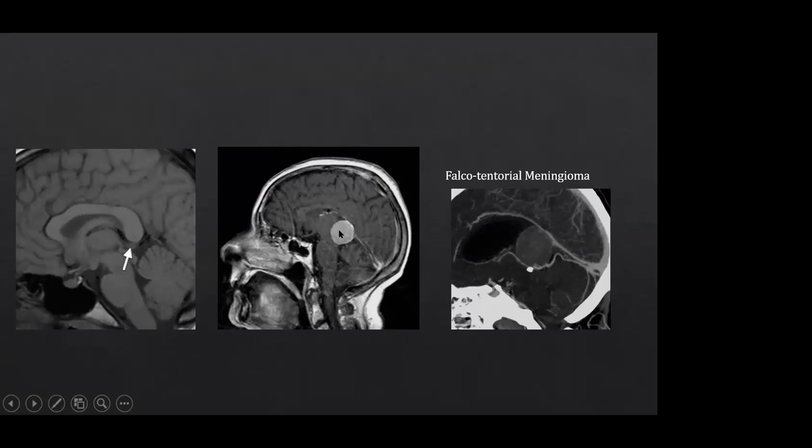And here we have a patient on the MR scan where you can see the meningioma at the junction, but very important to identify the anatomy so that the surgeon can plan the resection, whether they have to come in above the sinus, above the tentorium, or indeed underneath the tentorium, to realize the anatomy of the internal cerebral vein as it is displaced by the tumor, to realize how the inferior sagittal sinus is stretched above it. And in fact, the internal cerebral vein, instead of draining into the vein of Galen, is draining much more posteriorly into the straight sinus at the level of the torcula. So this kind of anatomy is quite crucial whilst planning surgery.